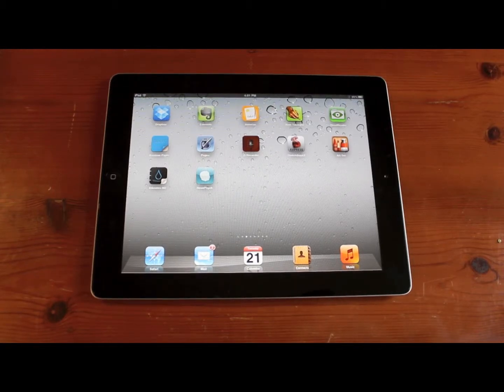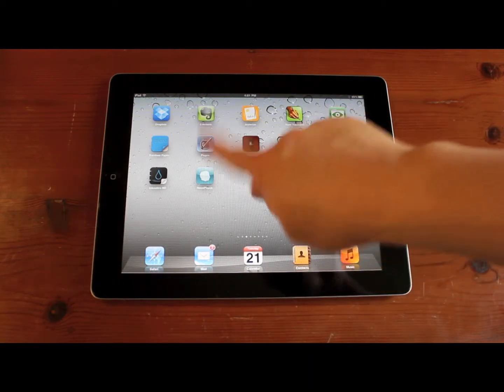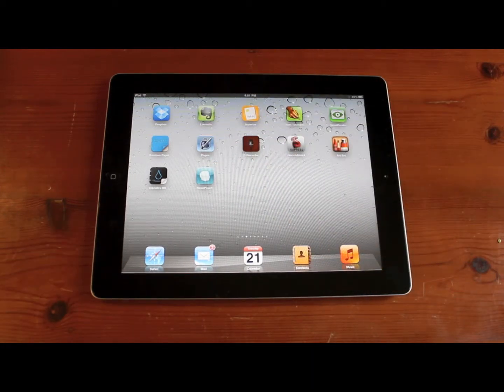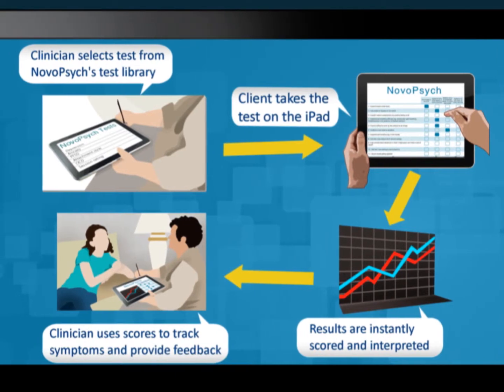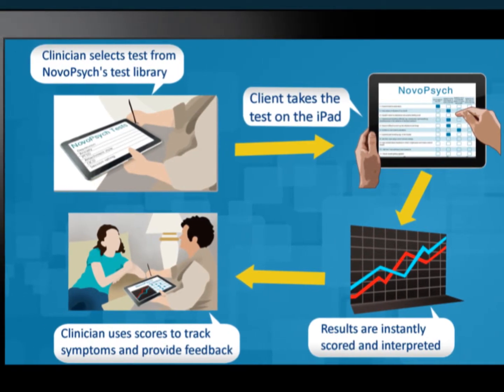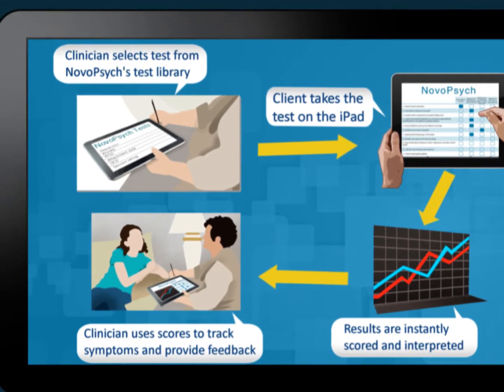Okay, so today I'm going to show you a new app that I've just downloaded called NovoPsych, and this is the icon for it right here. This was recommended to me by a good friend because I regularly administer psychometric tests, and I have found this app to be so helpful in my work because it saves me so much time and is so simple to use.